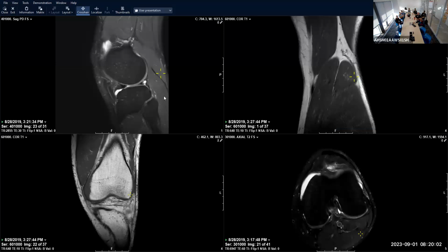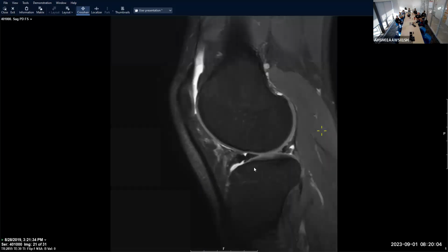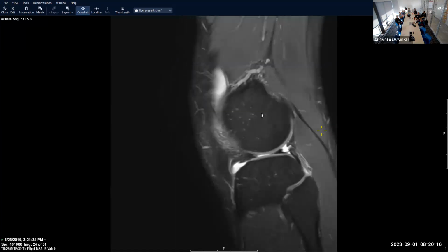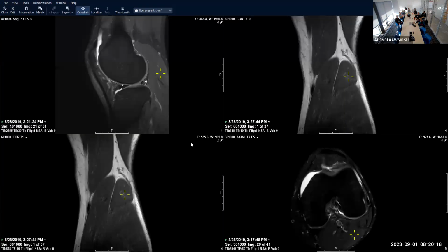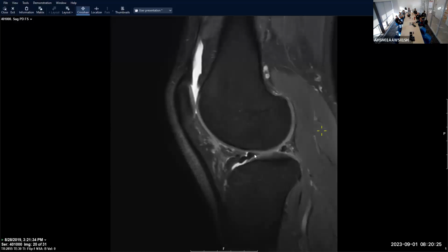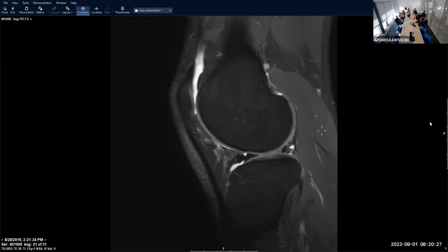Okay, so here is a classic sign that we have in MSK rat. You can see, hopefully, it's a little bit blurrier. Signal to noise is not as good. It's still a 3T, but it's our Philips 3T. The other one was our Siemens 3T, I believe. It's just a blurrier picture. It doesn't look as pretty. Okay, so anybody have a hint or guess as to what is going on in this picture?